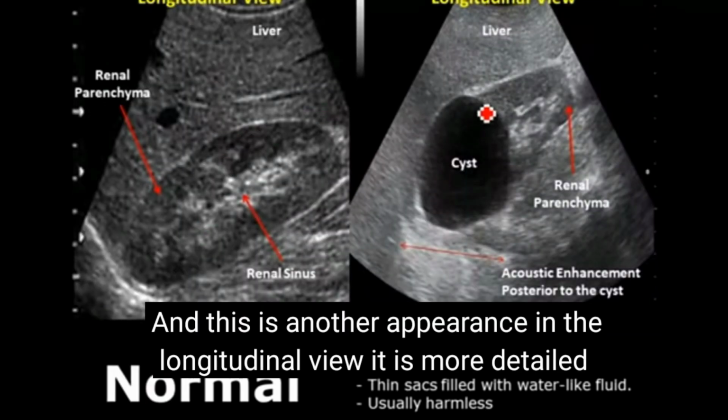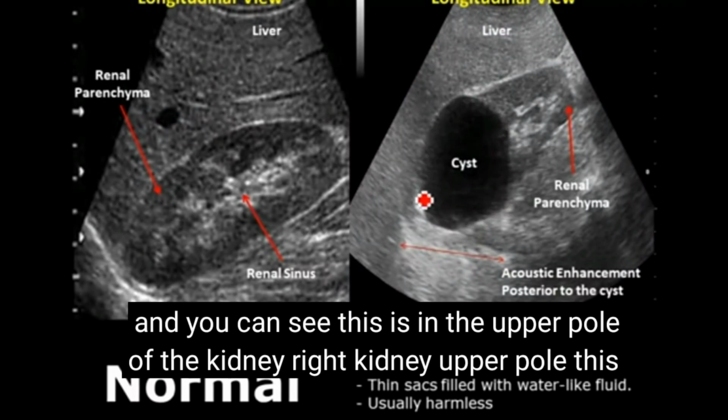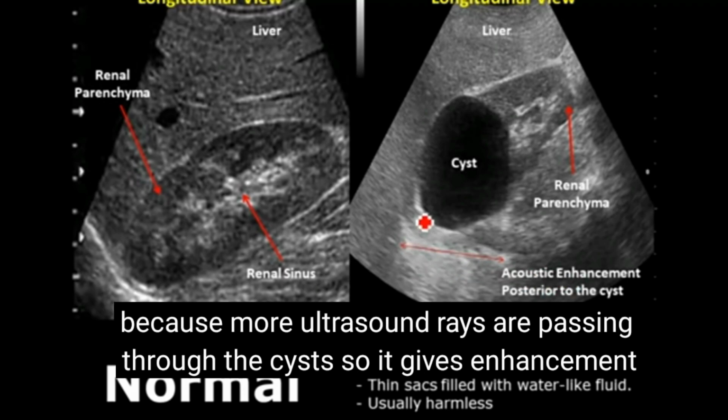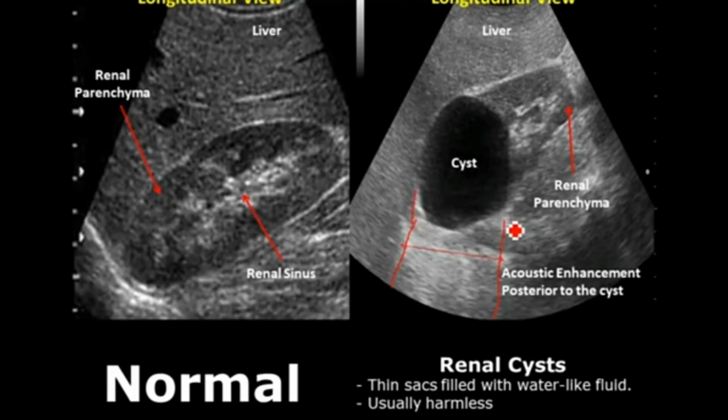And this is another appearance in the longitudinal view. It is more detailed and you can see this in the upper pole of the right kidney. This is again the acoustic enhancement which is behind the cyst. It will be a hyperechoic region, because more ultrasound rays are passing through the cyst, so it gives enhancement.